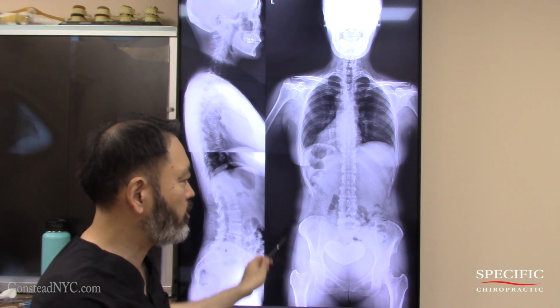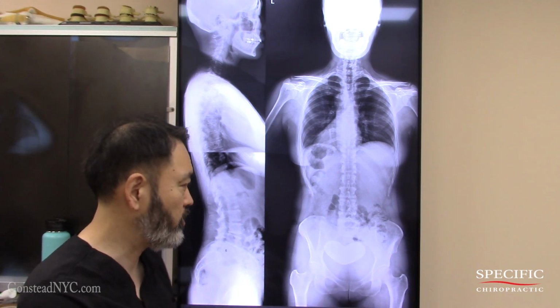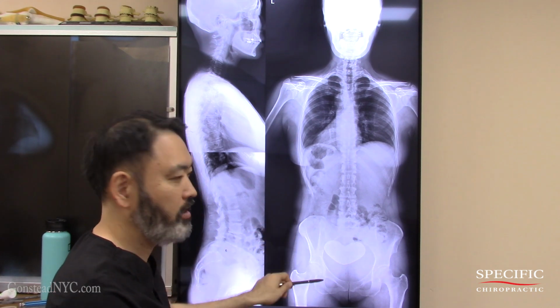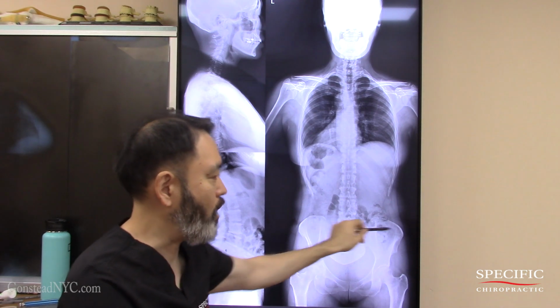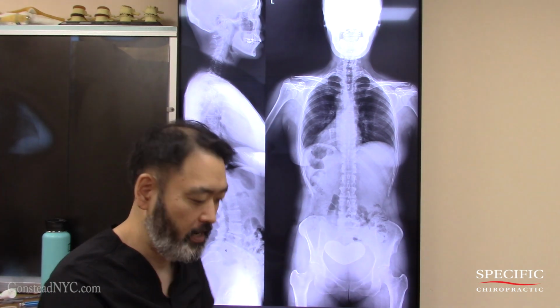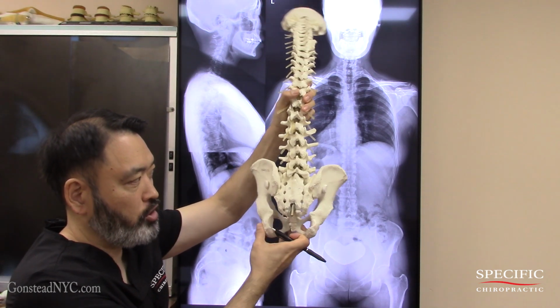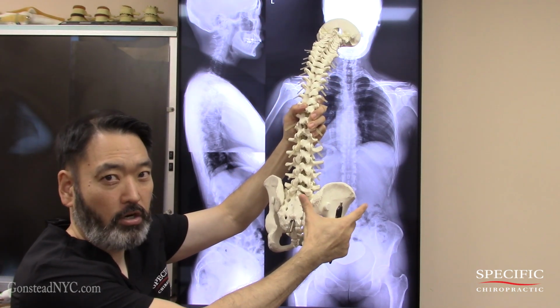So then we take a look at what the actual misalignments of the hips and the sacrum are. When we look at this, the width is narrow here and wider here. So we've got an external rotation, an EX, and an IN on the right side. Projection-wise, if it externally rotates, it becomes narrow, and this becomes wider.